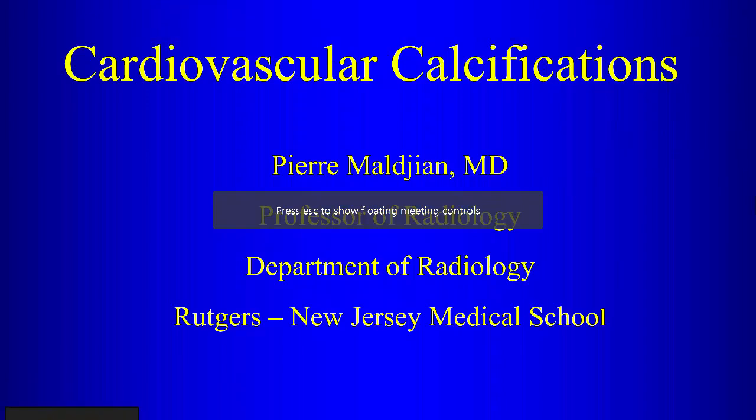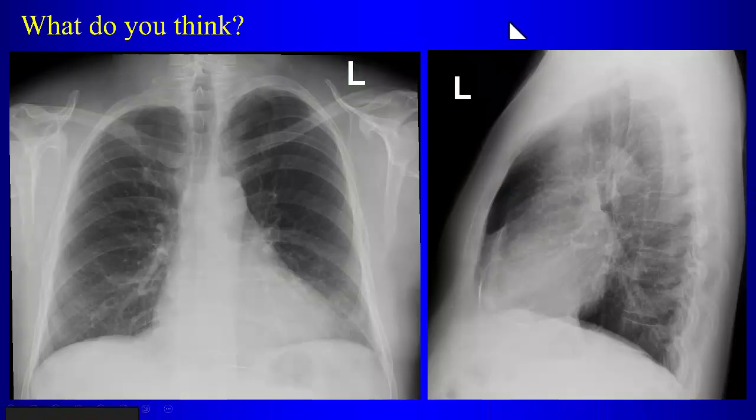All right, so today we're going to talk about what we need to know about cardiovascular calcifications. So we'll start with this case here. What do we have to say about this?